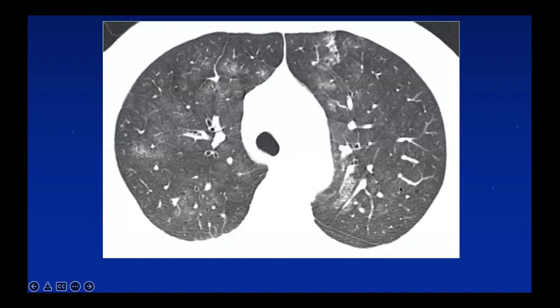So let's look at this patient who has these areas of higher density and these areas of lower density. The question often is which area is abnormal, which is normal. Most people, when they read this, they just assume it's ground glass opacity, but we can't assume it's ground glass opacity. We have to differentiate patchy ground glass opacity from mosaic attenuation. The official definition is if you look at an area with the denser area and you look at the darker area, are the vessels similar in size?